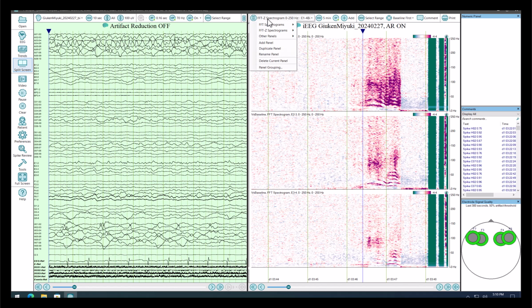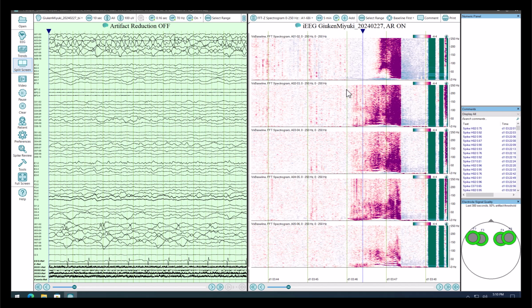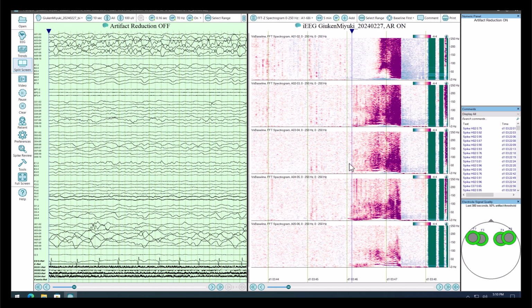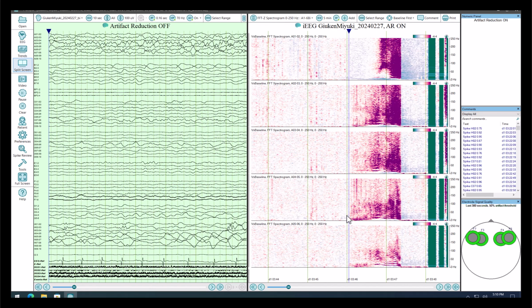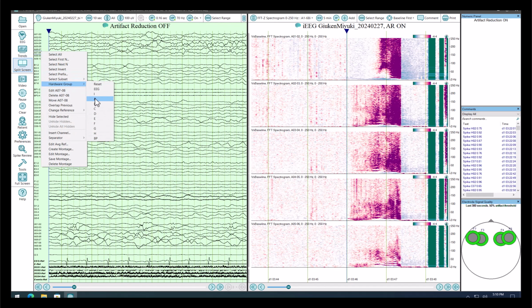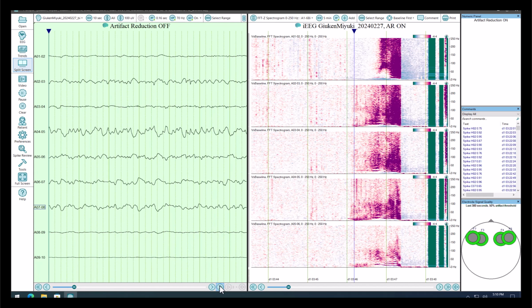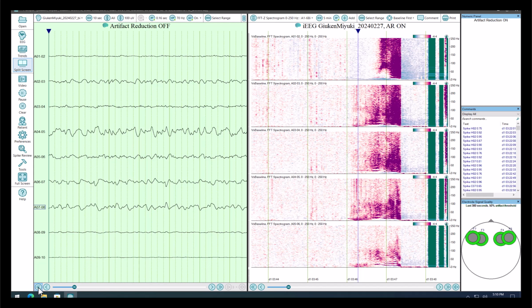So let's start with our first group of interest. We'll go back to this, and we'll look at that channel A1 to 6, because we see all this activity here. And I'm going to click back a little bit where I see that high frequency begin. And this one, I expect to see most of that showing up in channel 4. Let's go ahead and hide some of these electrodes. So I'm going to select hardware group, I'm going to pick group A. And I'm going to page into this, see if that looks like it is indeed an onset.